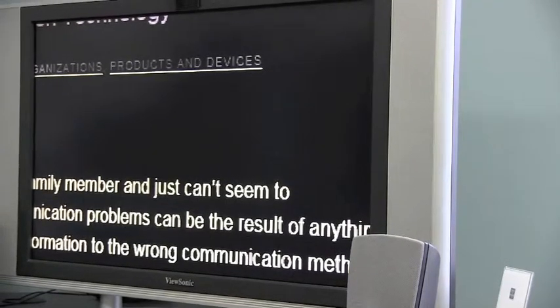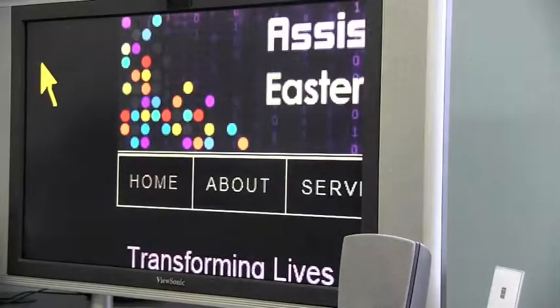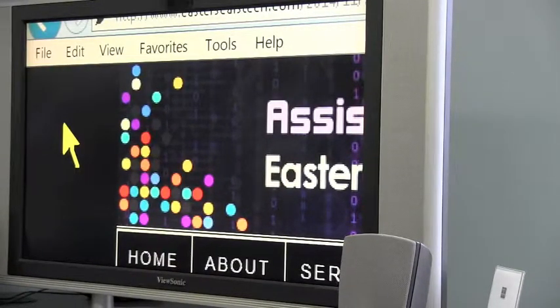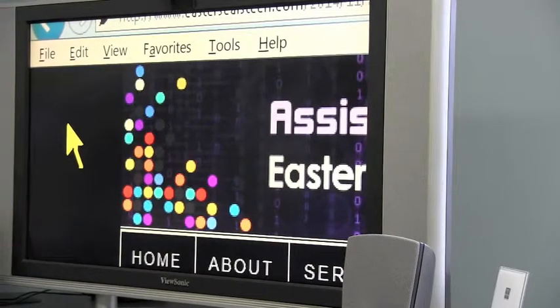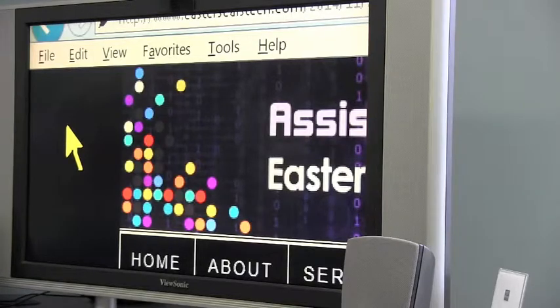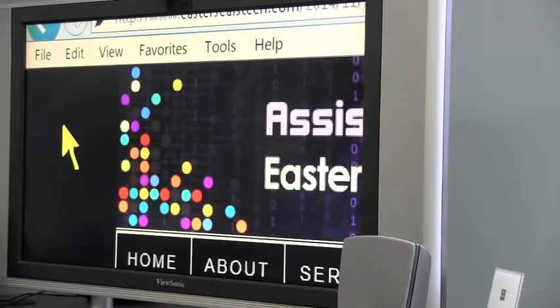This can be used in Word documents, online, or pretty much anywhere where there is text on the screen to be viewed. In order to turn off the speech function, if you get tired of it, you can just press the Alt-Shift-S once again. Disabled. That will disable it, and you can go back to doing whatever you were doing before.